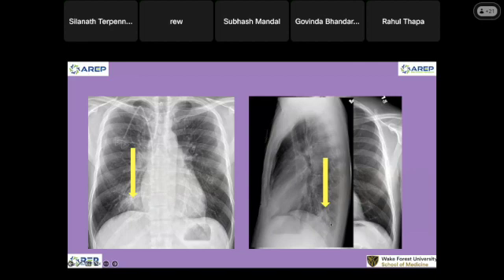So I feel confident to call the aorta here, right? This again, it's here, the lower lobe pneumonia. Okay. But this is on the left. Let me go back to the normal case. This is the density in the lung.